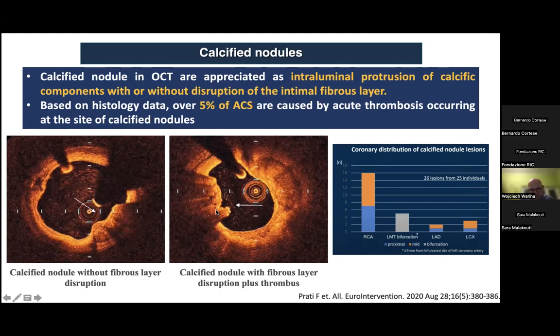Here you see the thrombus. There is the entity of the vulnerable calcified nodules, which is called eruptive calcified nodules, which is a new entity in interventional cardiology.